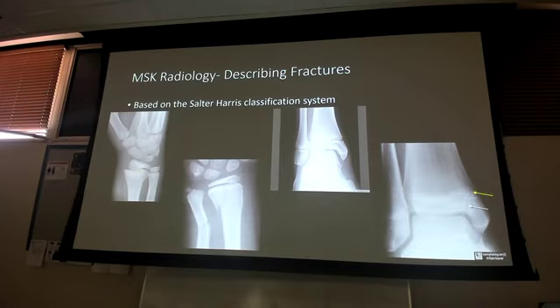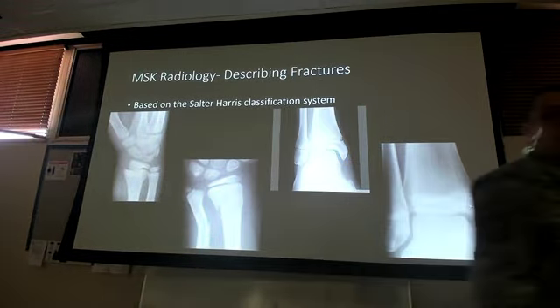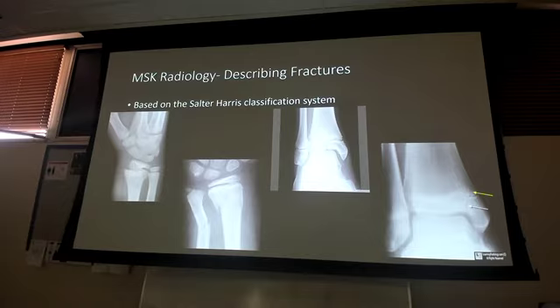Ulnar fracture, right? Right here. Borderline is that green sticker, transverse. It looks like it goes all the way through. You can probably see it better on your screen. It's really subtle towards the cortex. But yes, there's also the ulnar fracture.